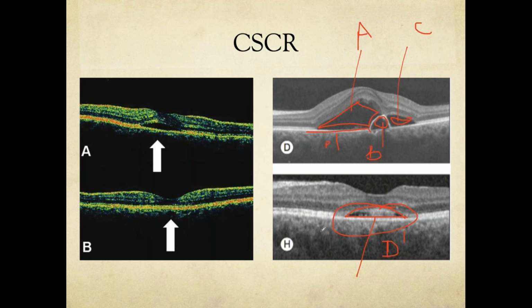Now, I would just want to point out one thing. E and F. What is the difference between the reflectivity of E and the reflectivity of F? Which is hyporeflective, E or F? Okay, good.